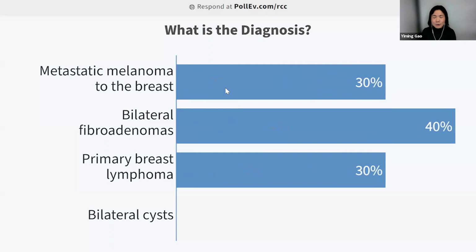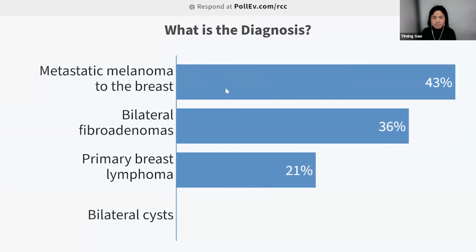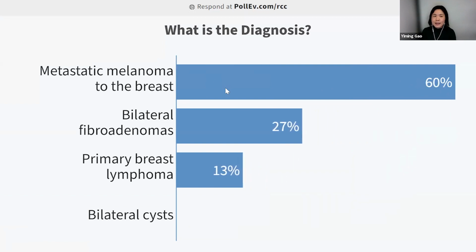Very interesting. So just thinking back to the patient, right? She is in her 60s. Her mass was enlarging, if you recall. And looking at the ultrasound does give you some sense of whether those actually resembled more benign appearing masses versus more malignant masses. And I like the trend of the poll. Hopefully my information is helpful. So yes, we can move on.